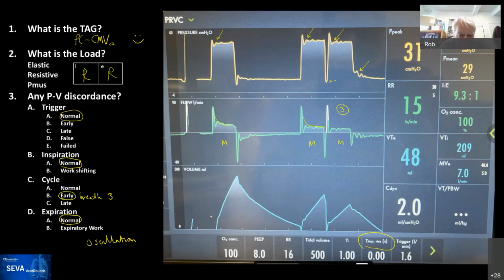And that's probably just the charge in the patient circuit coming out, because you have the compliance of the circuit basically in parallel with the compliance of the patient. We think of it as a single compartment model, but it's really not under these situations. And I bet if you calculated that volume that was exhaled rapidly, it's just the patient circuit compliance times the change in the airway pressure, somewhere along those lines.